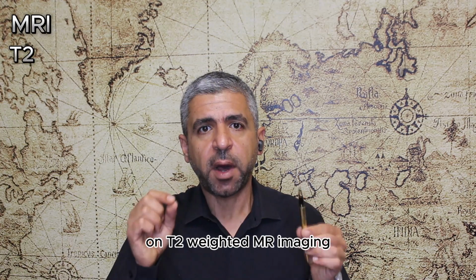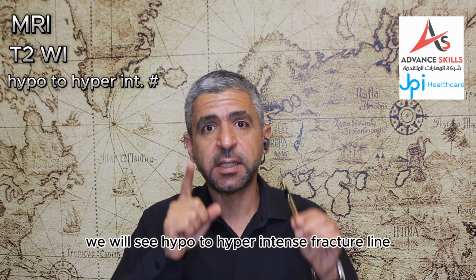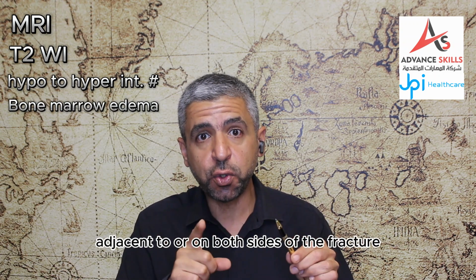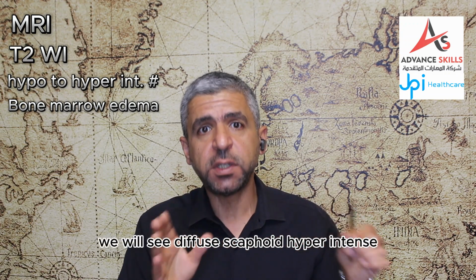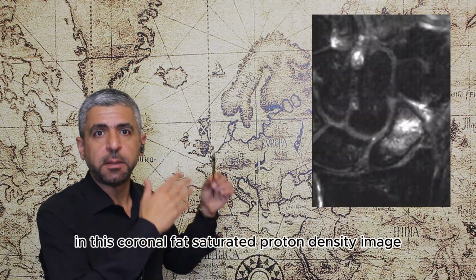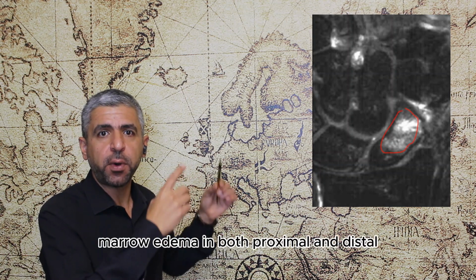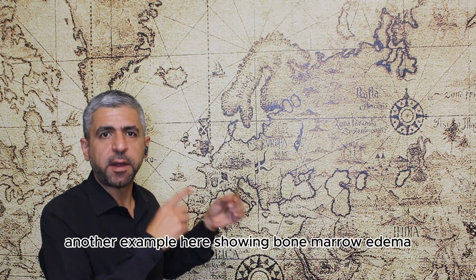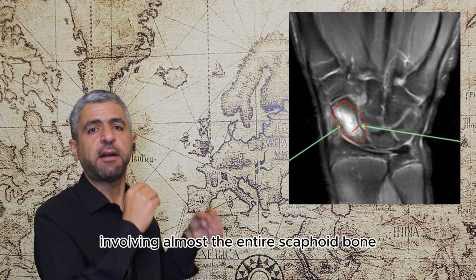On T2 weighted MR imaging, we will see a hypo to hyperintense fracture line with hyperintense bone marrow edema adjacent to or on both sides of the fracture. Less commonly, we will see diffuse scaphoid hyperintense bone marrow edema. In this coronal fat-saturated proton density image, we see hyperintense marrow edema both proximal and distal to the scaphoid fracture site. Another example here showing bone marrow edema involving almost the entire scaphoid bone.